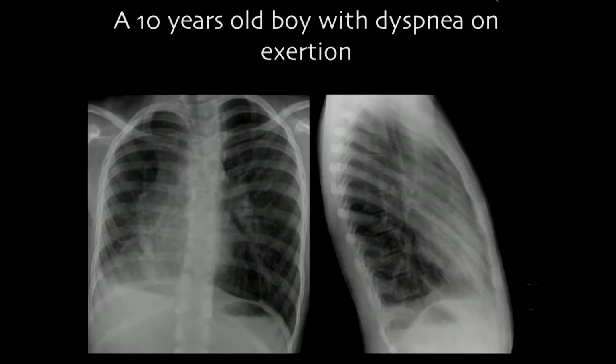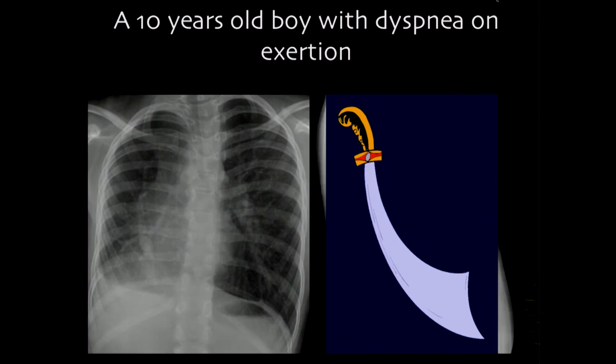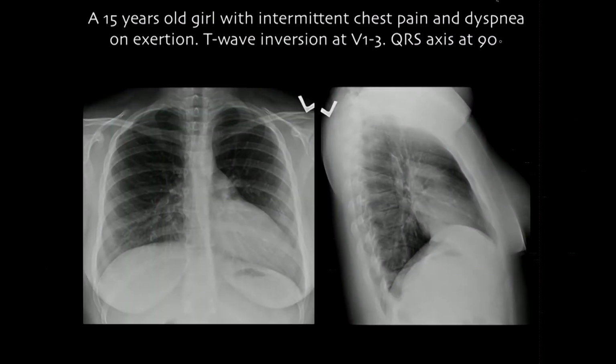Okay, so this is classic scimitar syndrome. You have small right lung, and then this is a scimitar vein coming down. Usually you have a little bit of retrosternal hazy opacity here. Okay, so this is a scimitar vein here, a little bit obstructed in this case, and then the similarity between this one and this one gave us the name scimitar. Okay. So if you know the presence of this entity, you can make the diagnosis from plain film.